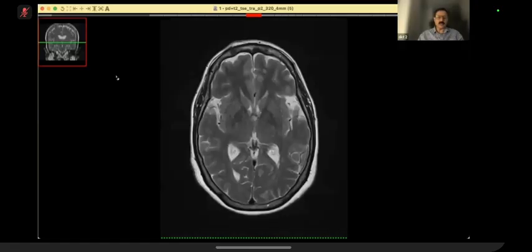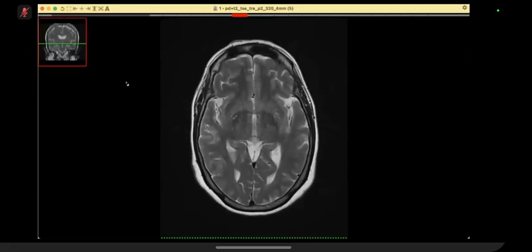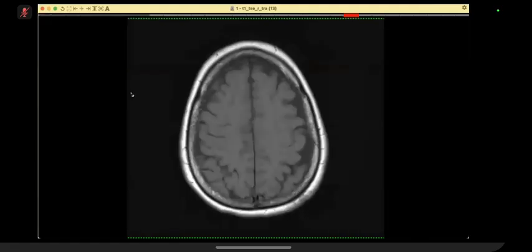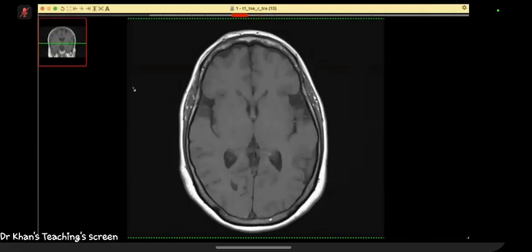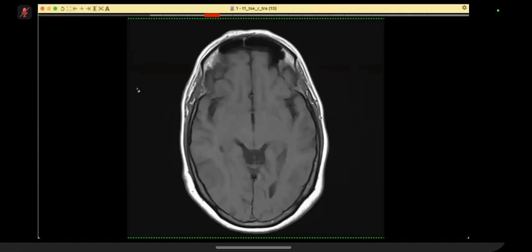So this is the lesion on T2. I'm showing you the T2. The lesion is also hypointense on T2 in the center, with no significant surrounding edema, just subtle. I am just concerned if this is a cavernoma. T1. The T1 is relatively hypo to isointense to the brain cortex. I need contrast, please.